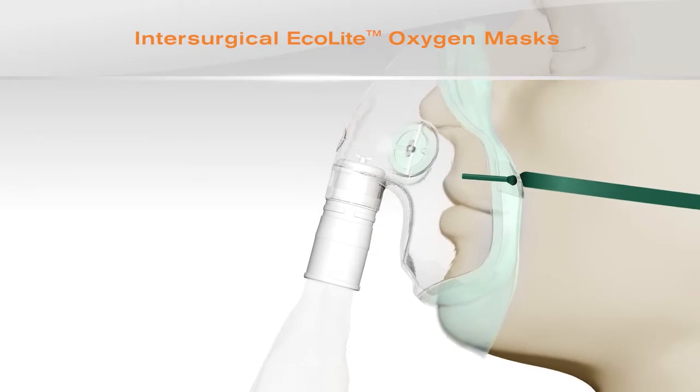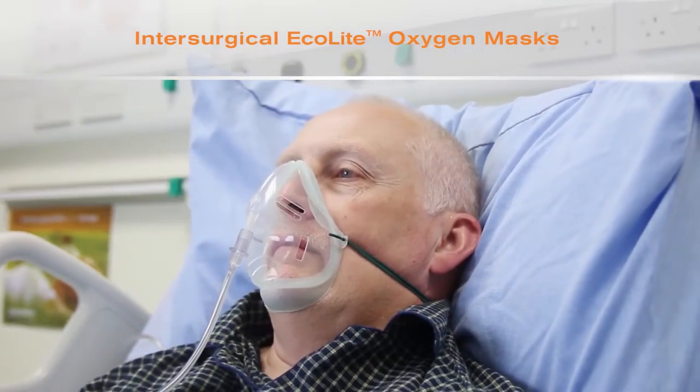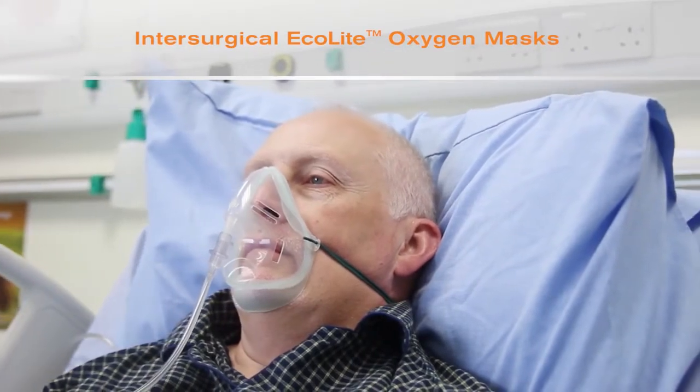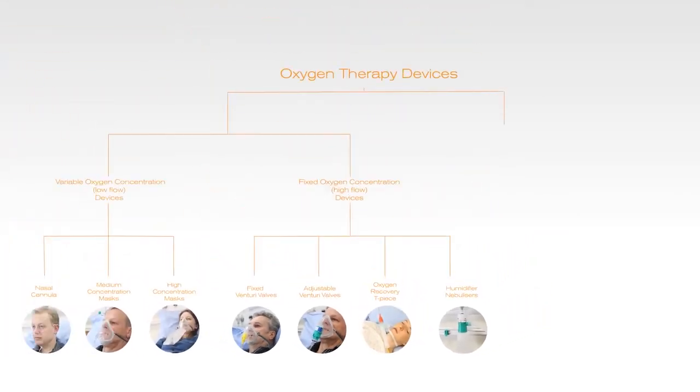Intersurgical Ecolite oxygen masks have also been designed to address tissue viability requirements by reducing the risk of pressure sores developing. The final section covers the different types of humidifier that deliver cool humidification.